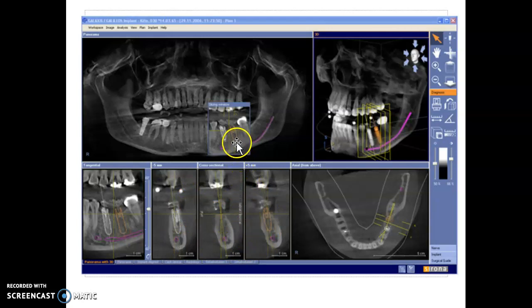So what they're trying to decide, if they were going to place these 2 implants, again, you've got your mandibular canal highlighted in pink, they're trying to decide what angulation would be best, and they can figure out where the thickness of the bone is by looking at the horizontal slice. They can also look at any indentations or thin areas, like this one's a little too close to that facial surface here. But also, that purple outline is your mandibular canal. So they've outlined it here.